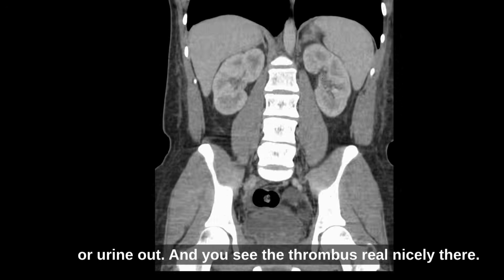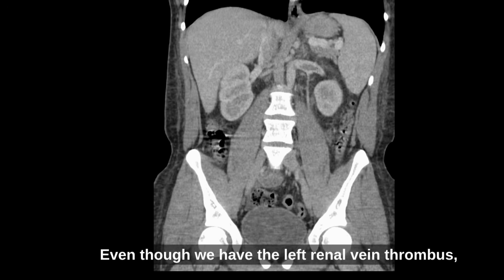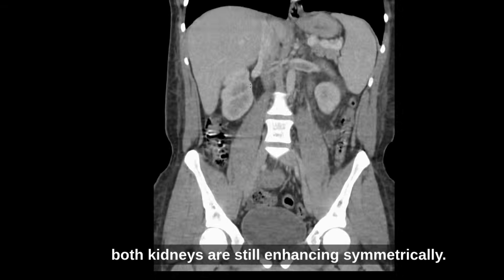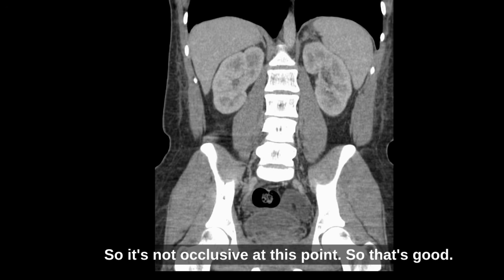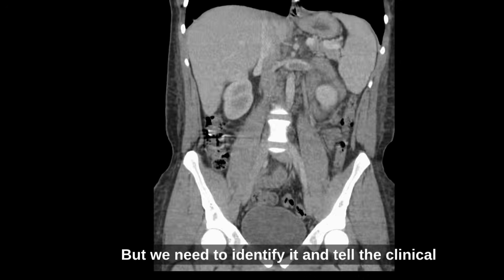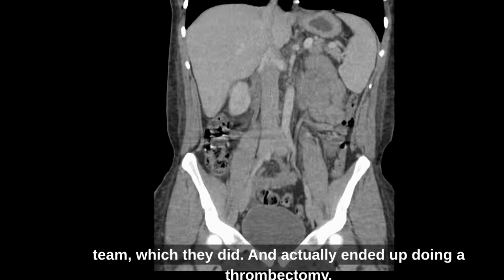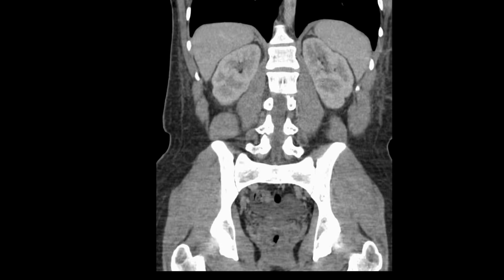Now, even though we have the left renal vein thrombus, and you see the thrombus real nicely there, both kidneys are still enhancing symmetrically. So it's not occlusive at this point. So that's good, but we need to identify it and tell the clinical team, which they did, and they actually ended up doing a thrombectomy, and the patient did well.